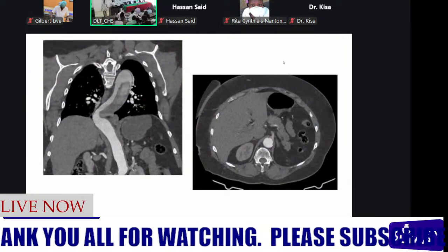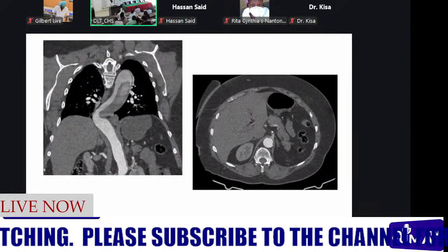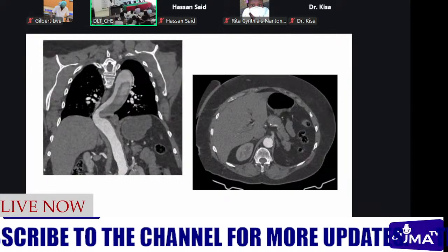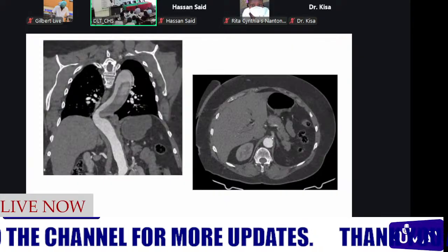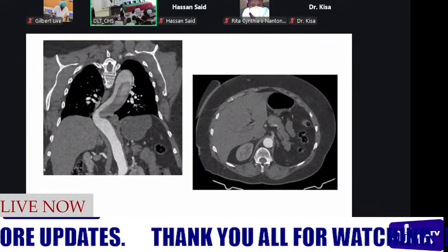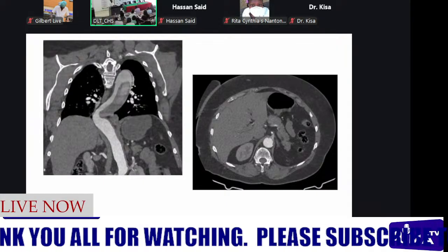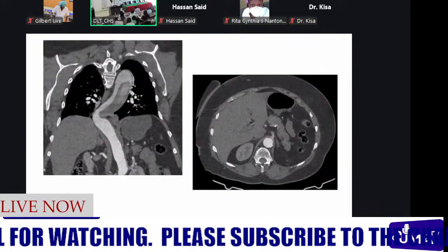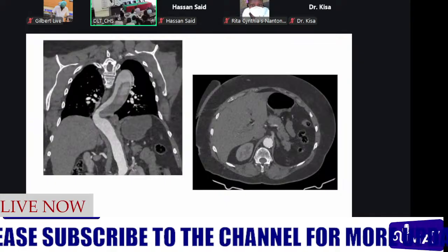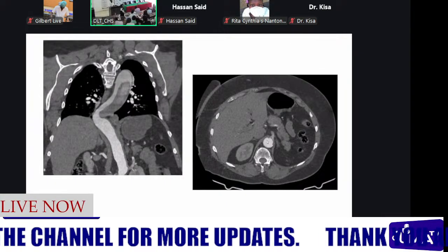So we are at the level of the celiac trunk, which is our first branch of the abdominal aorta. And I already said initially that we had some limitation. The opacification of the aorta wasn't really adequate. So at this point, when we were scrolling through, we could see that the density within the celiac trunk was less compared to the density within the aorta at that level. However, when you follow through the celiac trunk to its branches, that's the splenic artery and the common hepatic artery, it was lighting up just like the aorta. So we thought the celiac trunk is probably coming off the true lumen.